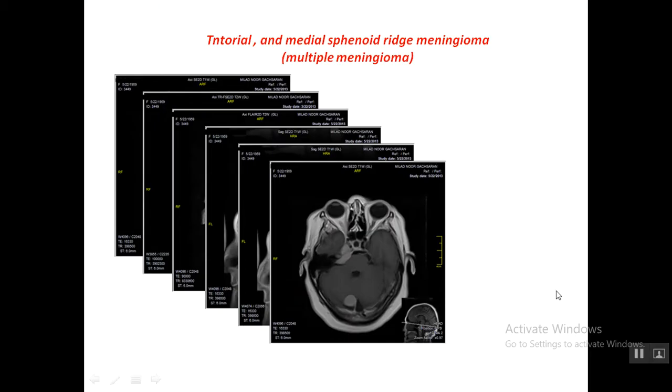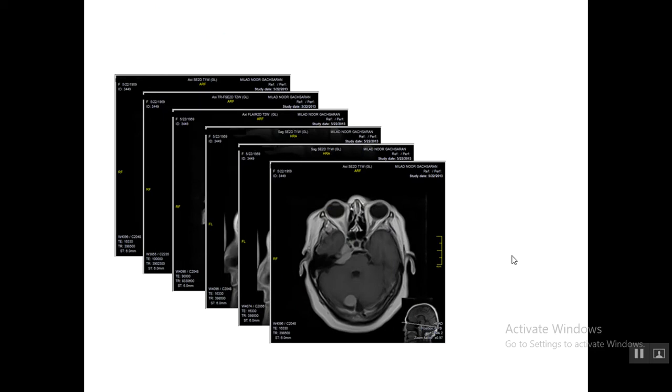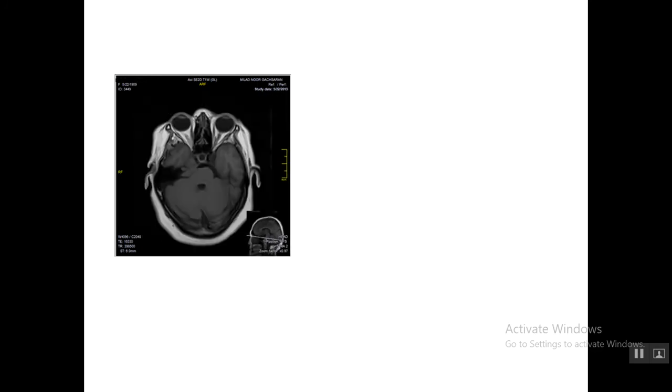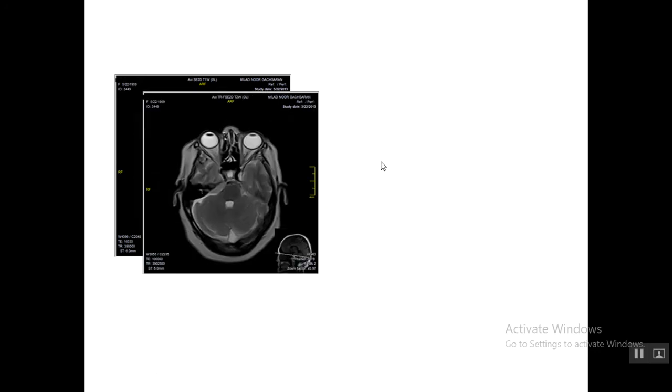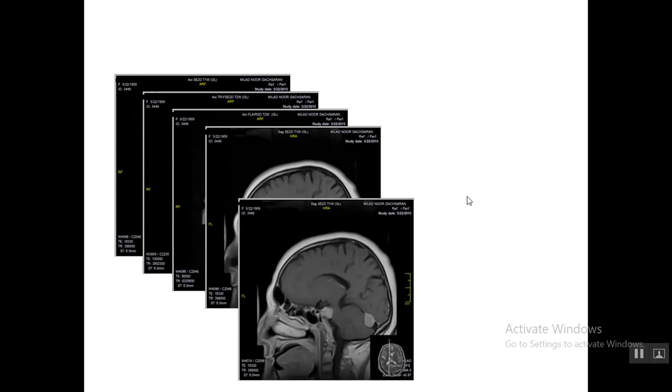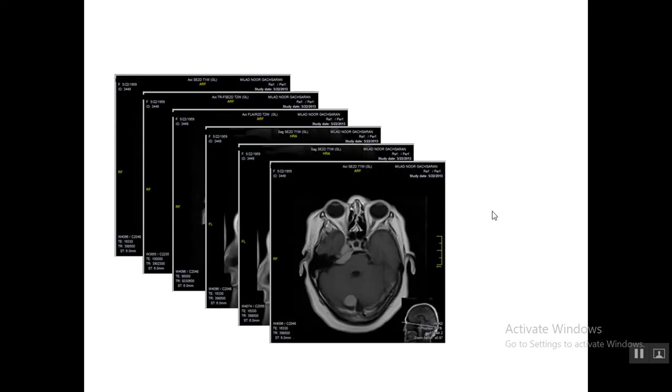Okay. We can review again from the first image. Notice please, and correct your review of everywhere of the images.